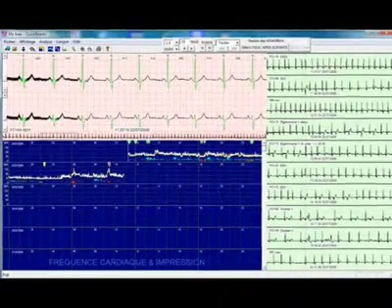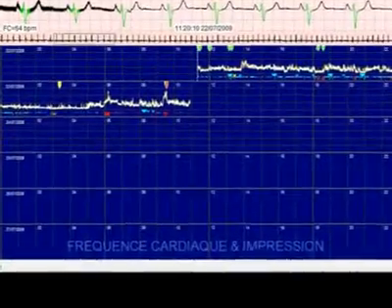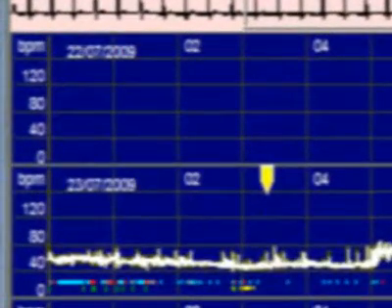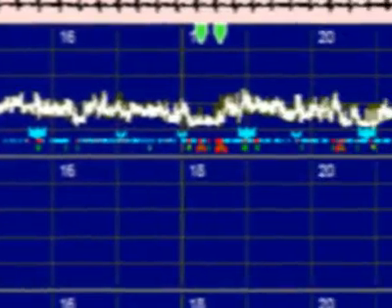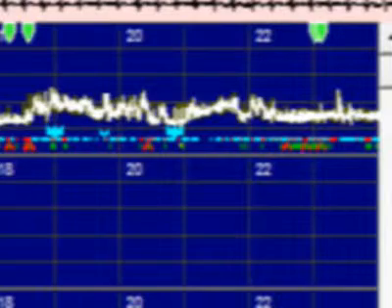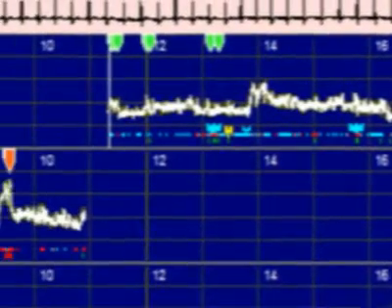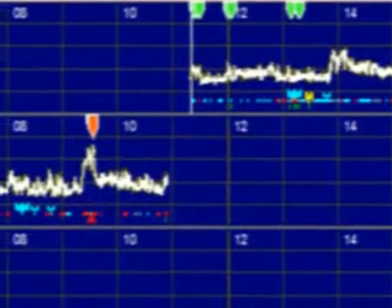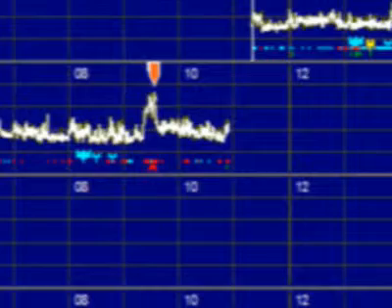The trends are displayed by default with the 6 24-hour trends. Each band will therefore be 0 hour on the left, midnight on the right. The date is displayed on the left. The patient has a trend that starts at 11:20 on July 22nd and ends at 10:53 on July 23rd. The time slider is positioned at the beginning.